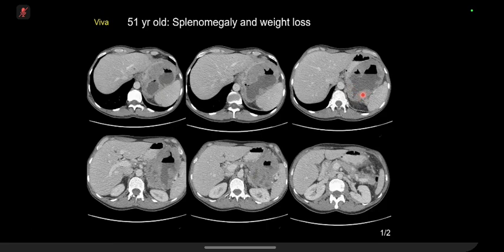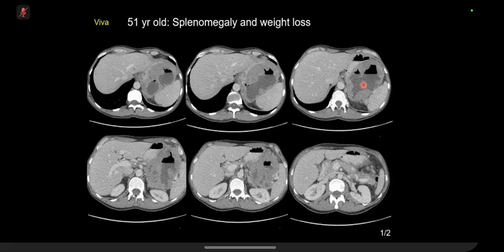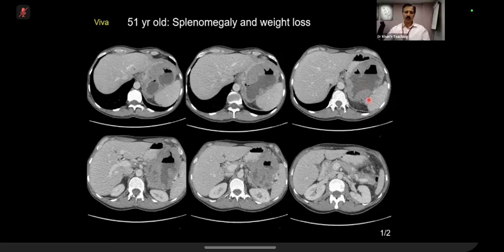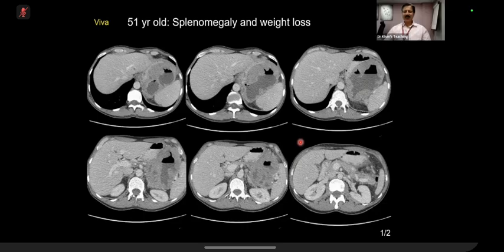Yes. Okay. What is this? And what is this? Oh, so the more medial structure is the stomach. Excellent. So what is this? So that looks like it could be a collection, a large... Okay. Pancreatic. So, okay, hint. It is in the same differential which you just did. That's the hint.